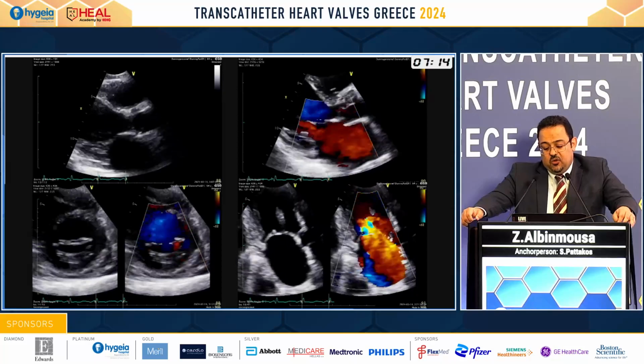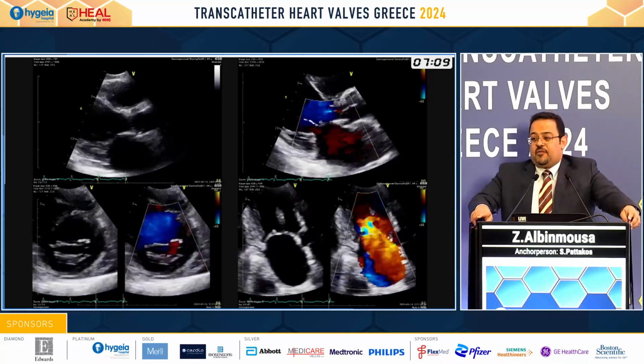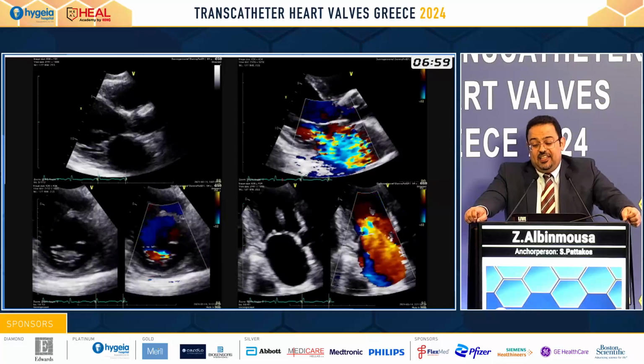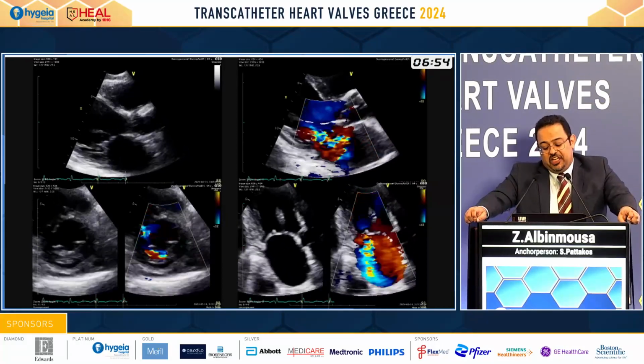But the question: what do you think about the posterior mitral valve leaflet? So it's functional, let's say. Do you agree or not? We were really concerned about the posterior mitral valve leaflet, and we thought that there were some rheumatic changes.